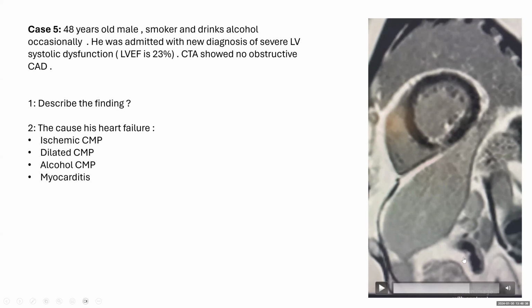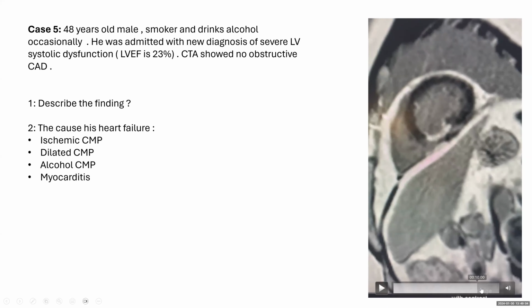So we know that here, north is the anterior, anteroseptal, inferoseptal. This is lateral or anterolateral and infralateral. And this is the only clear lateral wall. So it started a little bit infralateral, but as we go down, it is more of inferior.